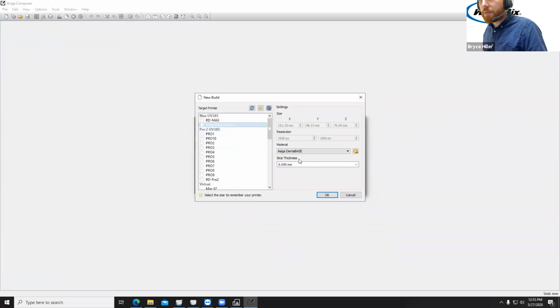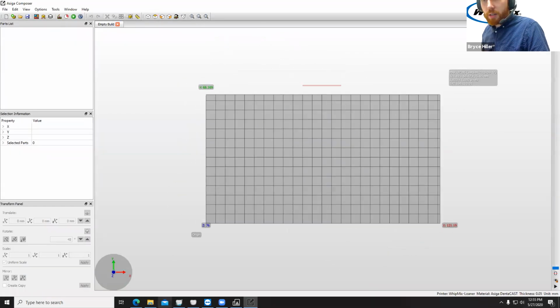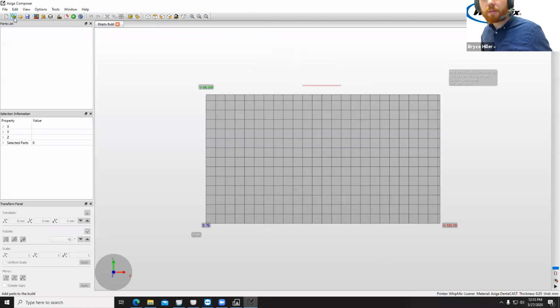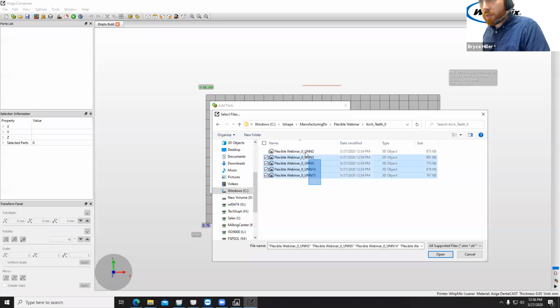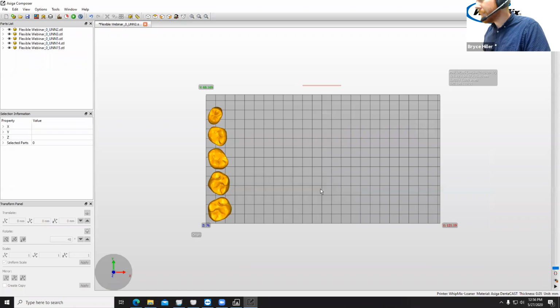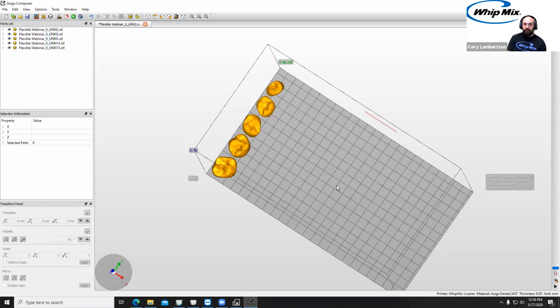We'll just select anything, it doesn't matter what. Let me copy that manufacturing directory file path. Now let's import all these. Hopefully it should. It didn't. I was wrong. I wonder why, Corey, they don't bring those in the same coordinates. Hang on a second. Oh, wait. Go up to your, go as if you're going to import a file again. I'll show you some.